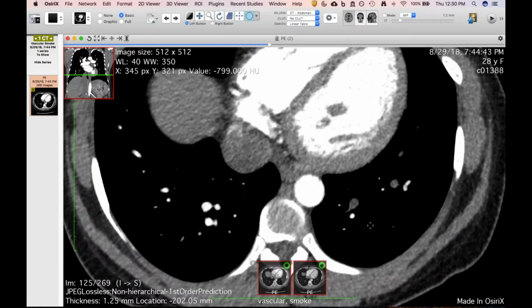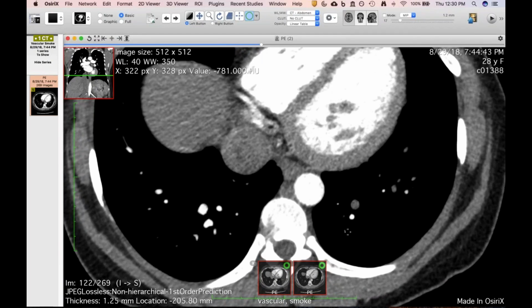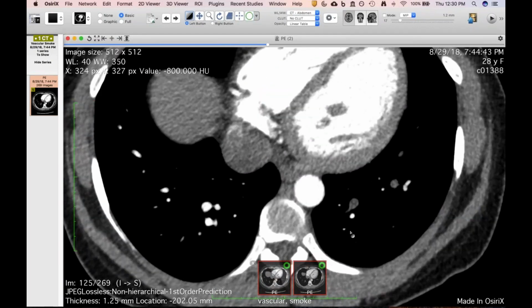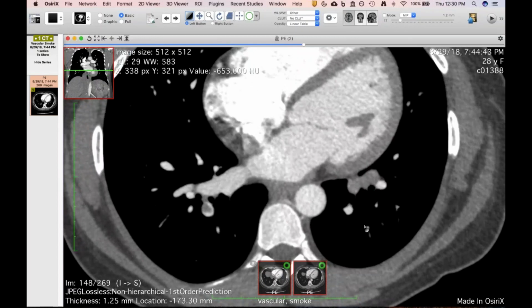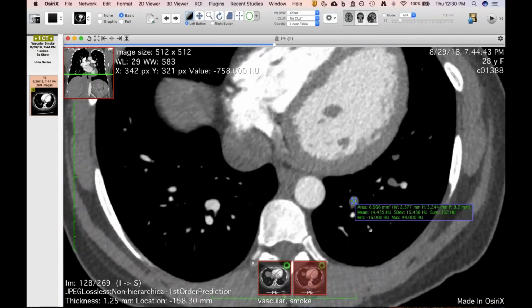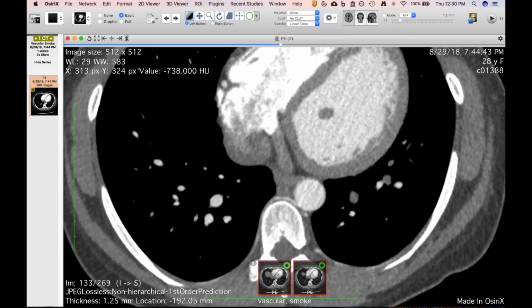Yeah. Okay. Yeah, it was just a pretty peculiar one because if we had no contrast in the aorta, I would have no problem saying that. But the fact that there is a lot of downstream opacification, I still think you're right, that's my best guess, especially because the interface more proximally is just gradual. But I thought it was an interesting one. And I don't know if we'll get follow-up. Hopefully we do, but just thought I'd show that.